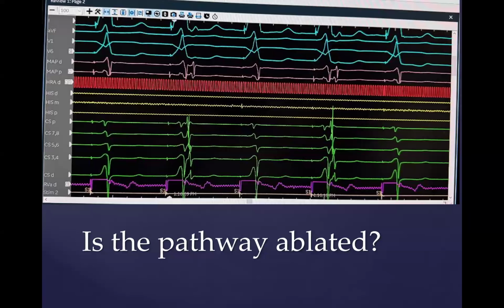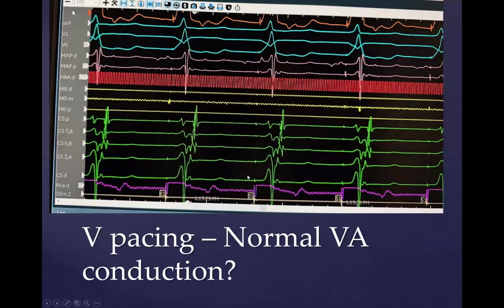Yes. So accessory pathways, are they adenosine sensitive or insensitive? They're typically insensitive, right? So if I gave the adenosine at this point in the case, I'd expect that this pattern would persist the entire time, right? Oh, so because you're giving it after, you're wanting to block the adenosine-sensitive tissue, which is typically not your pathway. So if you still had the pathway, you would see it. Right.